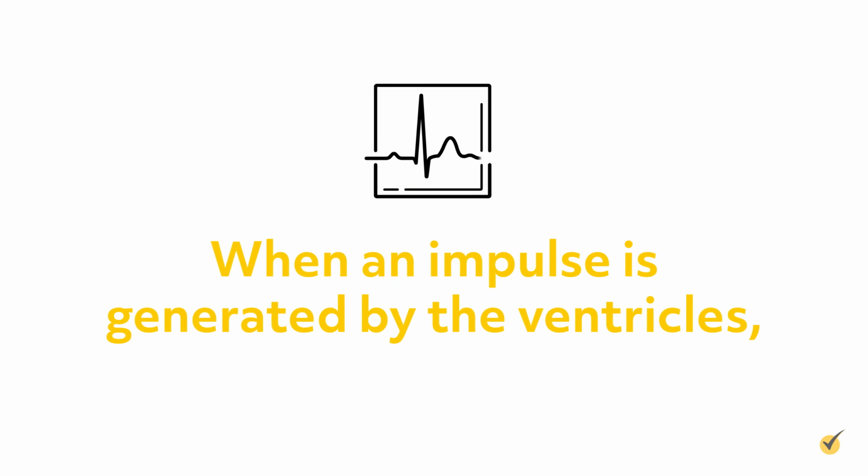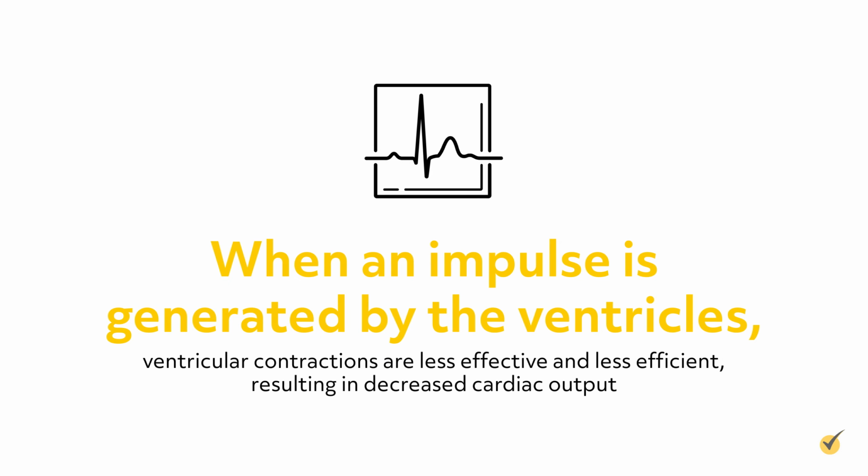When an impulse is generated by the ventricles, ventricular contractions are less effective and less efficient, resulting in decreased cardiac output.